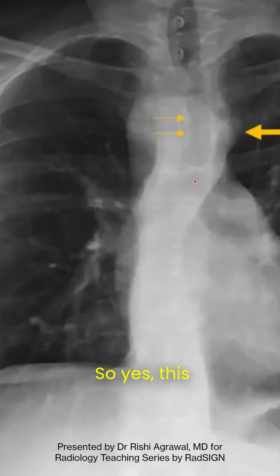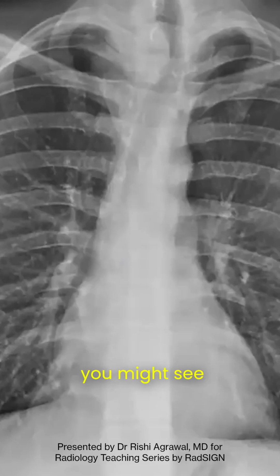So yes, this is a patient with a right aortic arch. And what you'll notice is that as the trachea goes down, rather than having that normal rightward shift of the trachea, this trachea is shifted to the left, okay? And in this patient, the reason why is because they have a right aortic arch. It's just another example of something that you might see that causes deviation of the trachea.